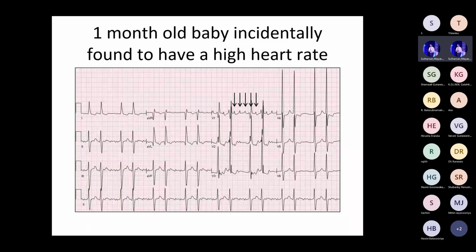So we'll quickly finish. So newborns, supposing a newborn has unusually high heart rates, we always do ECG. Newborns, neonates, infants. We have seen a lot of cases like this. So this ECG shows this picture. What is this? Anyway, it shows it's a tachycardia, but can you see there are multiple P waves, right? Multiple P waves, but there is a regularity as well.